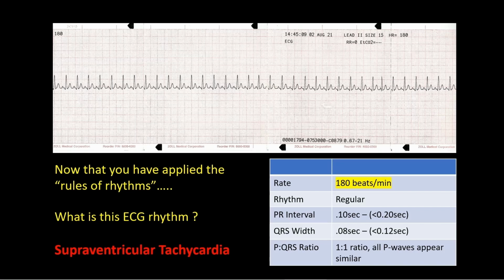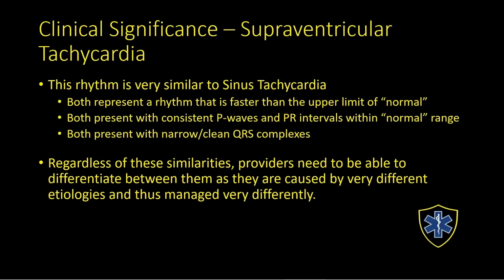Now, this seems a little bit strange maybe because of the fact that we have sinus tach or supraventricular tach. They're both over 100 beats a minute. The supraventricular tachycardia is much faster. You may also hear this rhythm referred to as just SVT. It makes it a little bit easier to get out, a little bit simpler to say.